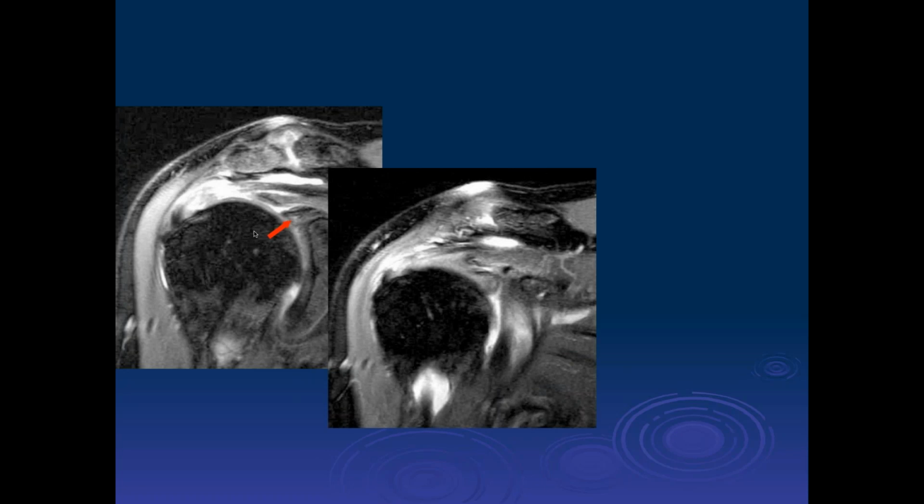Okay, I think it looks like the supraspinatus is torn. Supraspinatus too there. Yeah, and we have a lot of delamination, a little bit of retraction here. Then when we go into the superior labrum, we have a lot of abnormal signal and increased signal intensity. It looks like there may be some linear signal there in the biceps tendon, so we're concerned about that.